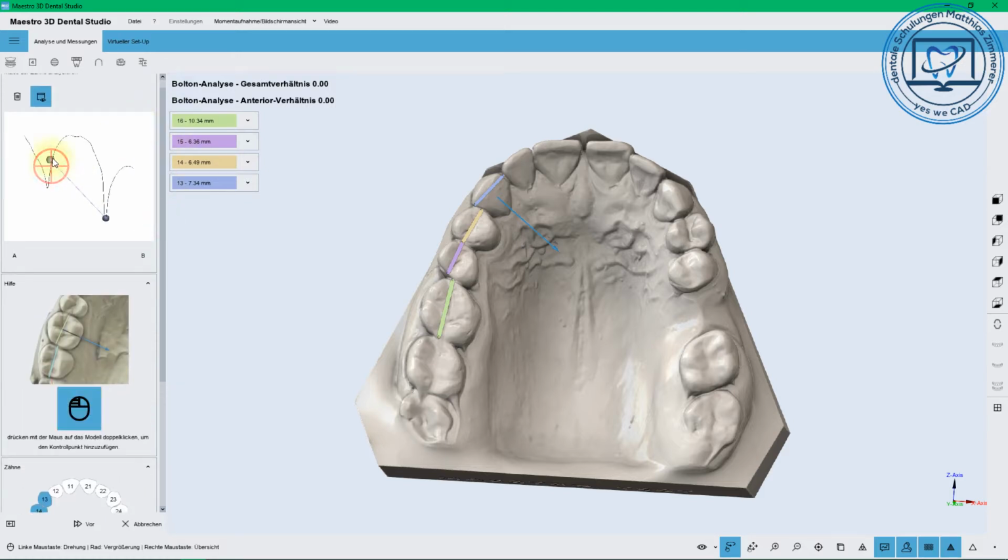You can zoom in, and here you have an easy option to set the wideness of the tooth by pressing the scroll wheel; you can move it to the left in the picture. And here you have the right dimension, so you don't have to rotate the models, and it's the fastest solution for this. Just click through, and if you begin on the right side, you will have no problems with the setup. In this case, on the first.